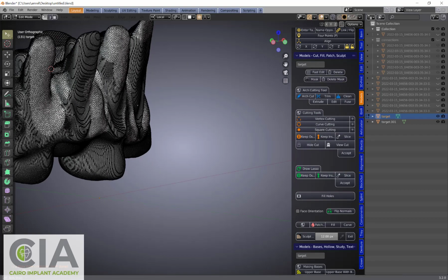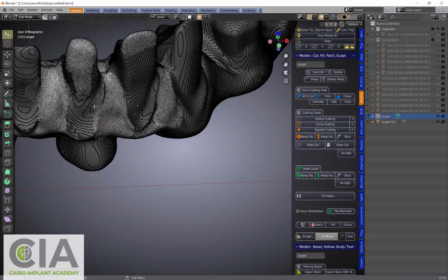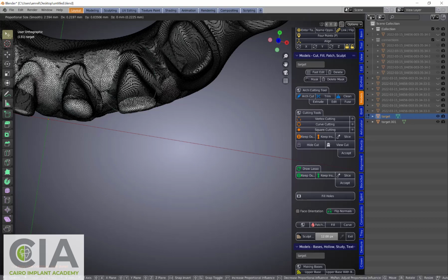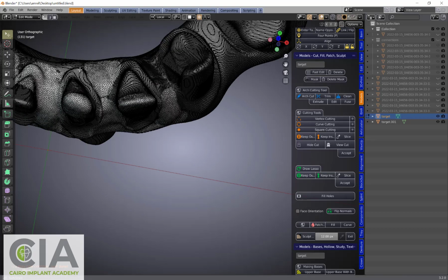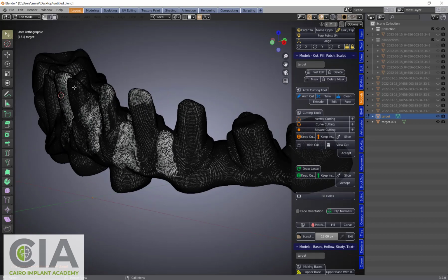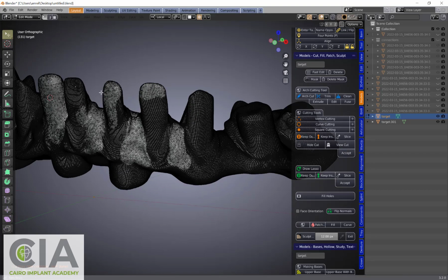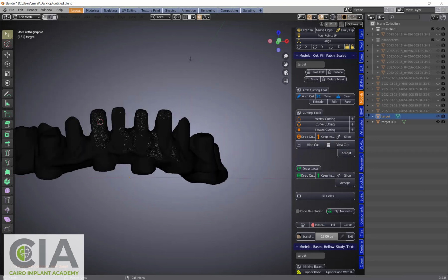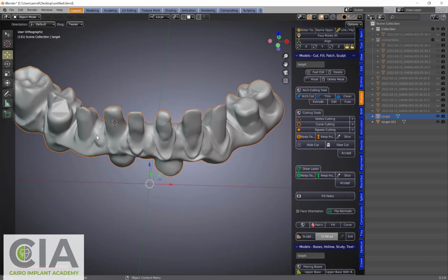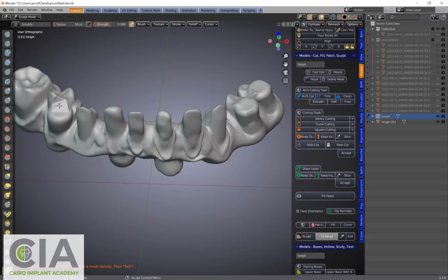It gives you a little bit of correction where you want to adjust your structures. A little bit, move this like this, and probably this is not okay. And then I'm out again, and this is for me okay.